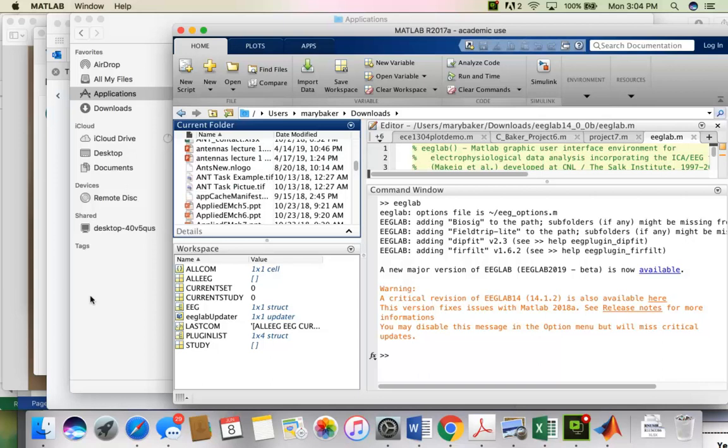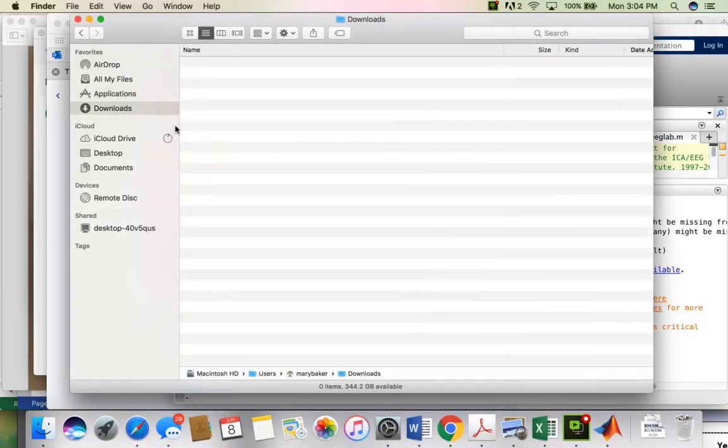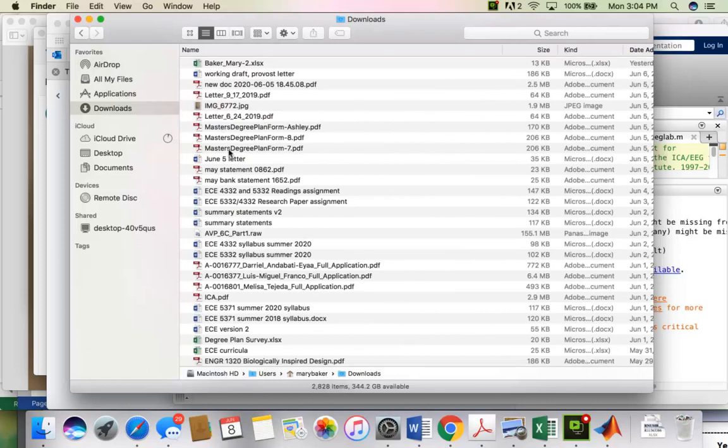Let me check my recent downloads to see what that file name was. AVP6C part1.raw. So the study had a part 1 and a part 2. Part 2 is just a repetition of part 1, so all we will work with this semester is part 1.